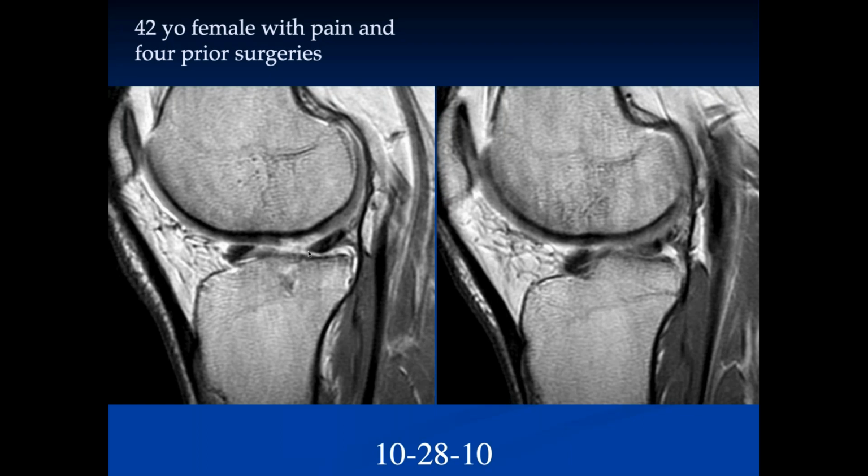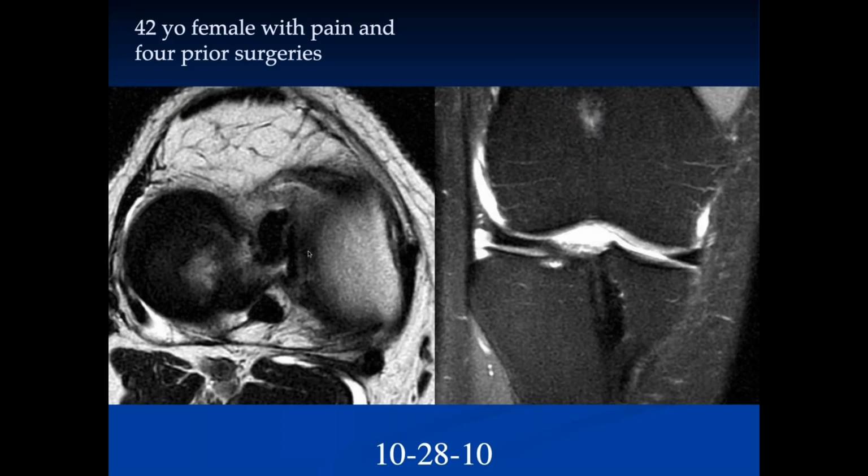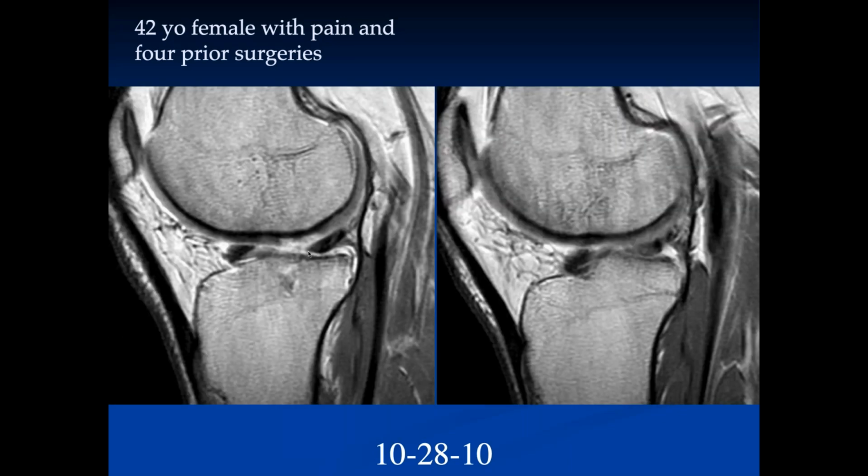Do you see arthroscopy scar anywhere? Here, let me go through some more images here. You should be able to see a scar somewhere.